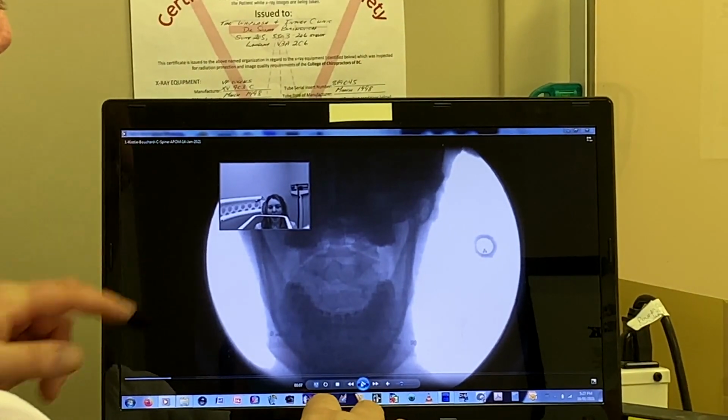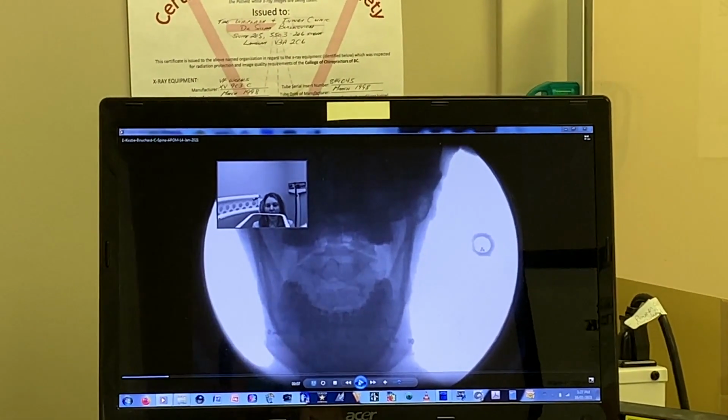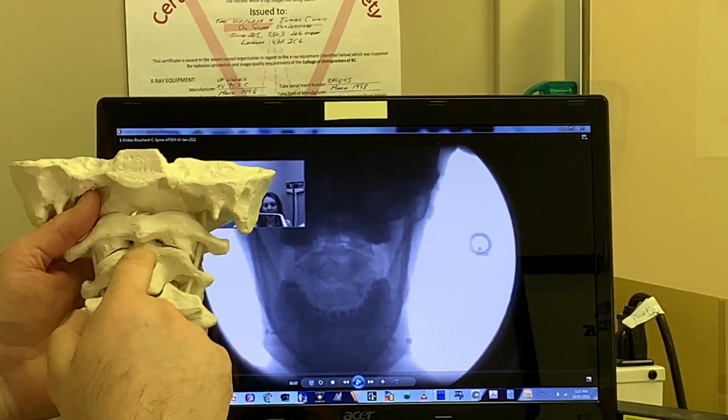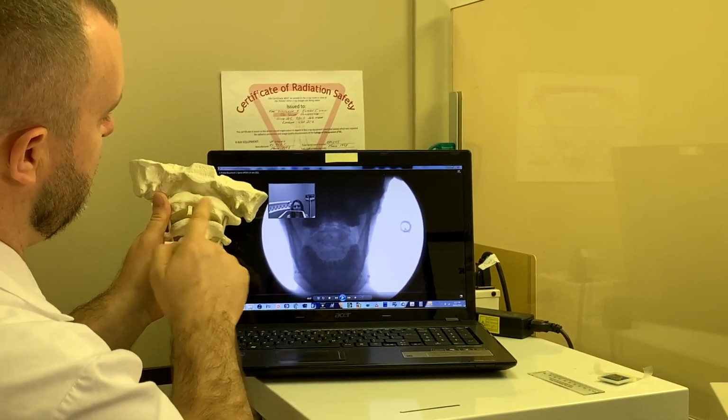Right now we're looking through your open mouth, and what we see are the top two bones. So these dark things here, those are your upper teeth and molars. And so with the mouth open, then we gain access to looking at these two bones. And so the top bone has this block on either side of this thin bridge.